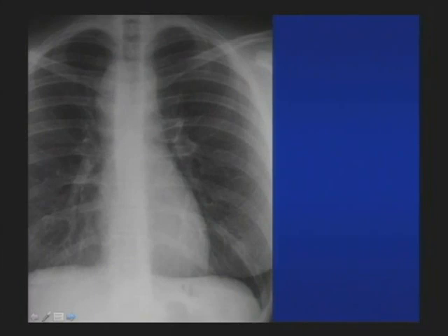Here's a classic chest X-ray, moving on to another topic, which shows opacity on either side of the trachea. And so it sort of looks the same, right? That looks like aorta, and then this also looks quite round. It's much too high to be azygous. So because of its appearance, we're considering some sort of aortic abnormality. It sort of looks like 2 aortas on either side.